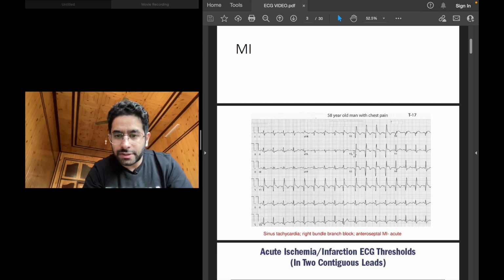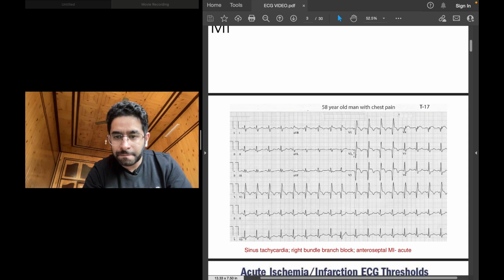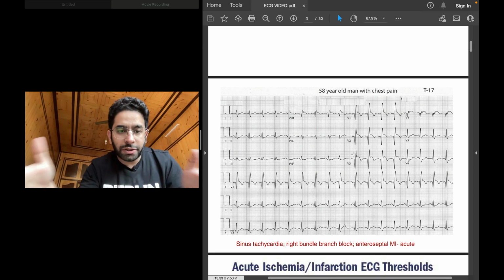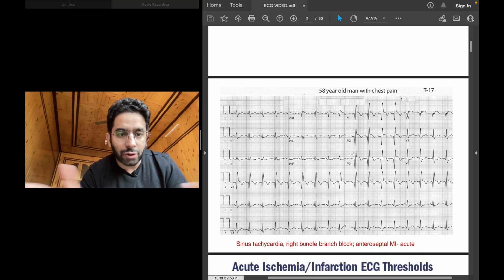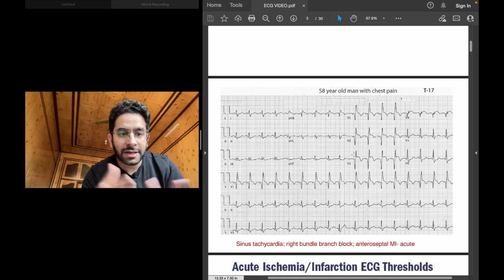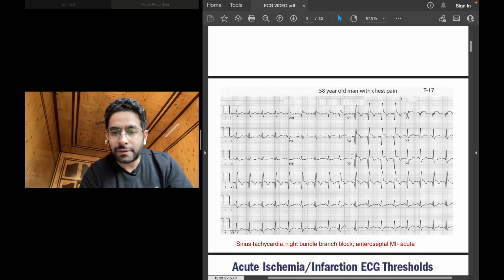Now if you take a look at this first ECG out here, there are ways to interpret ECGs in detail. Whether the ECG strip is properly standardized, what is the rate, what is the rhythm, what is the axis, what are the P wave abnormalities, the QRS complex abnormalities, STT abnormalities, and so forth, or some arrhythmia that you need to interpret.